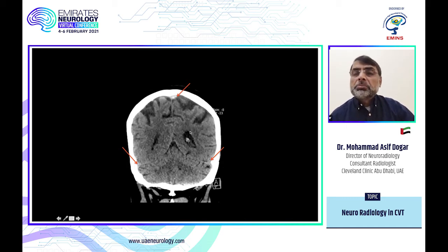Some people use some density numbers. I don't use that. It depends upon patient hematocrit, how well the patient is hydrated. I like this internal criteria of comparing the transverse sinuses and the superior sagittal sinus. So this differential density of the superior sagittal sinus is very worrisome for sinus thrombosis.